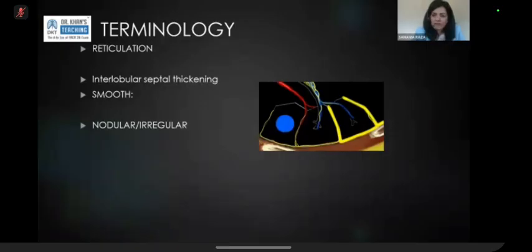You have a few specific cancers that give you irregular nodular septal thickening, and the most common one we see every day is breast. So when you have isolated irregular nodular septal thickening in a patient who has no history of cancer, that's not the first thing you're going to say on the scan. If it's a known patient or a known survivor of cancer, even if that's 10 years ago, breast cancer is the most common presentation. Even if you don't know the history, you see a mastectomy or bilateral breast implants, something along that line, or in the exam scenario, you have that history with you.